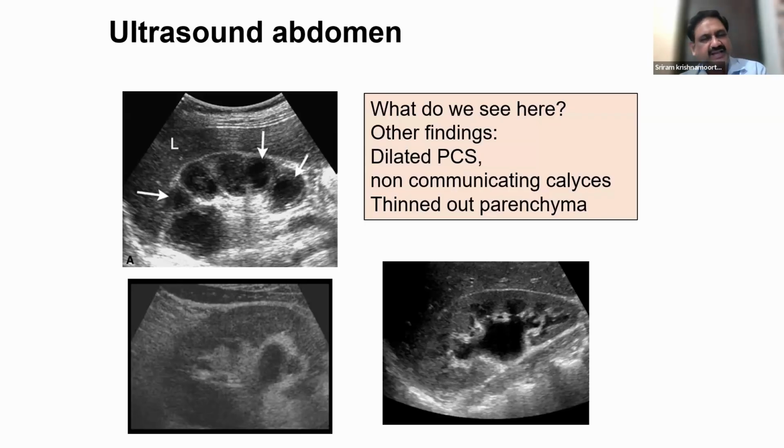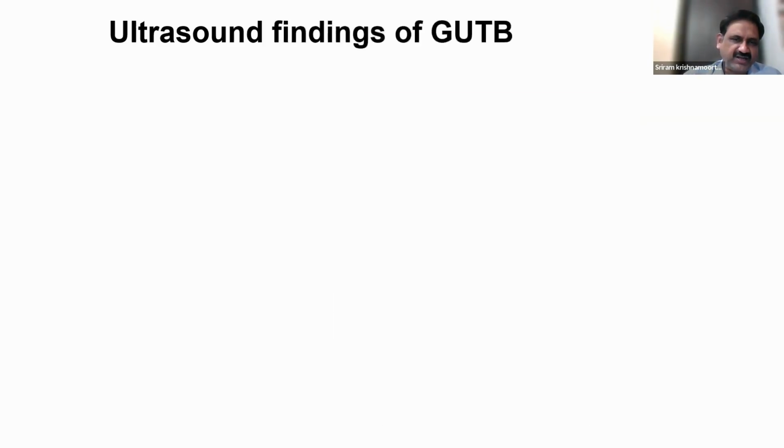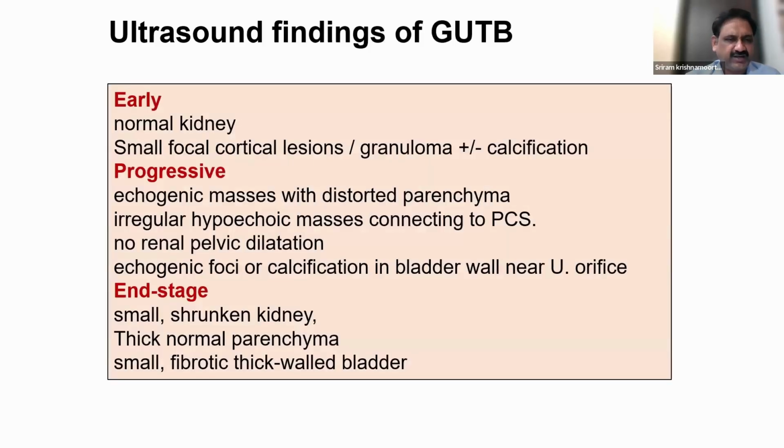The first one, the top left corner, that particular image shows that each of the infundibula was narrow and the pelvis is not dilated. The one in the bottom right shows that there is a distal obstruction either at the pelviureteric junction or further below, lower down in the ureter, which causes a global hydroureteronephrosis. So by this ultrasound finding itself, you will know whether the system is actually blocked at the infundibulum level, at the pelviureteric junction level, or at the ureter. Next slide. So this is the first information that you get with your ultrasound.